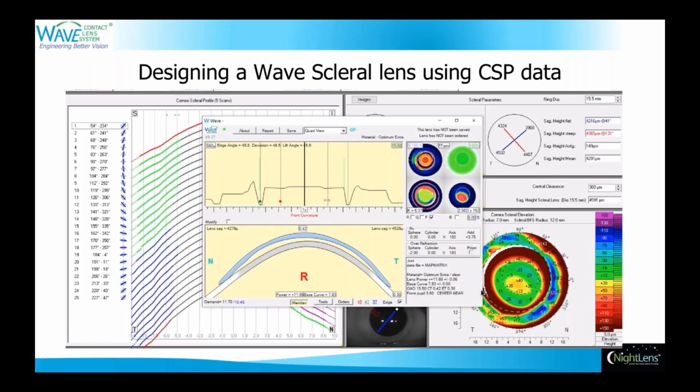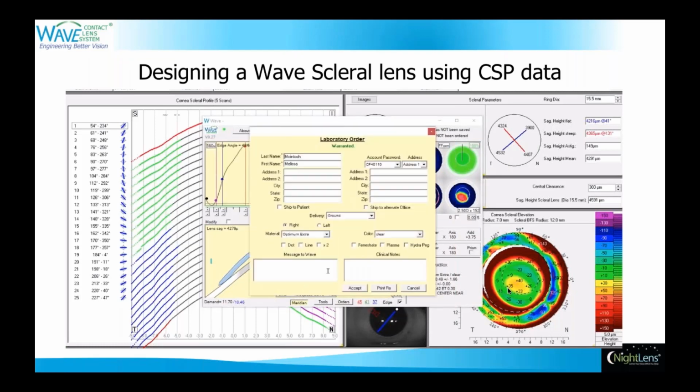And you might have noticed that the center thickness has increased ever so slightly because we've added plus in the middle. Again, that's where the red dots right there, we're controlling pupil size because you want a smaller pupil on the near center. And that's pretty much the way the lens is designed. Many docs who have used WAVE in the past may look at this and say, boy, this is a whole lot simpler than it used to be, and it truly is.